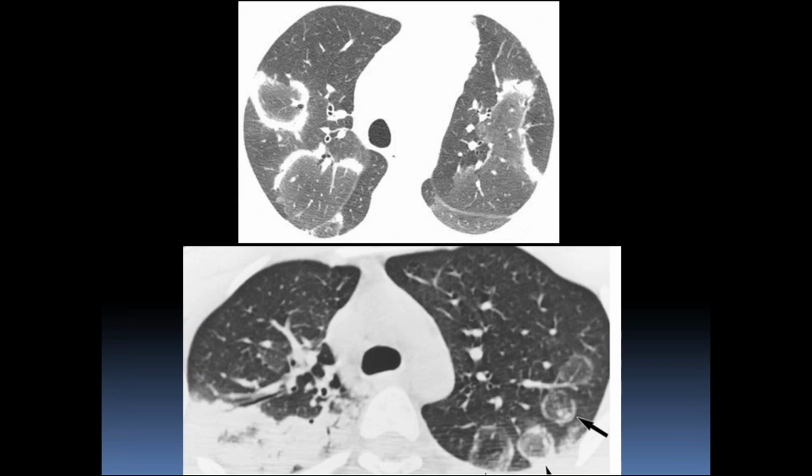So a couple of other different appearances of it, because it's not always typically one thing, like the peribronchovascular distribution. You can see that you have the atoll sign out in the South Seas and stuff like that. So you have these crescentic appearances with the ground glass. And then here is the reversed halo sign. Both of these findings have been associated with cryptogenic organizing pneumonia as well. All right, we're getting in the home stretch.